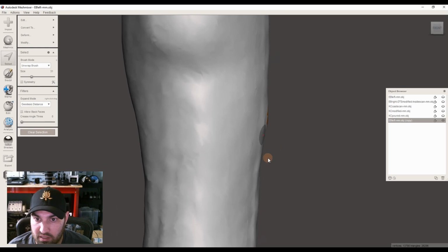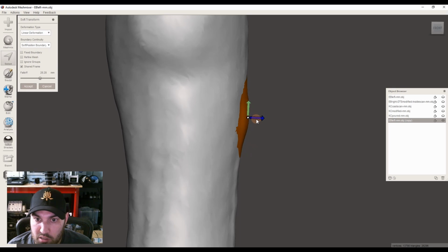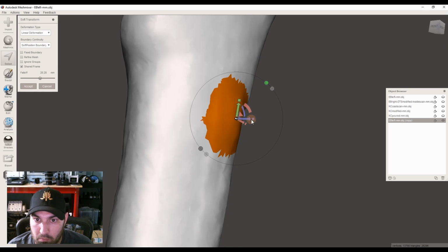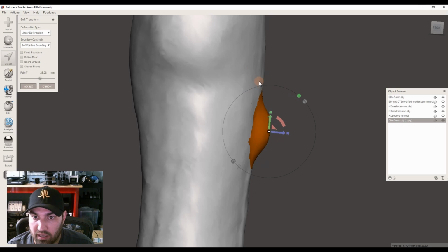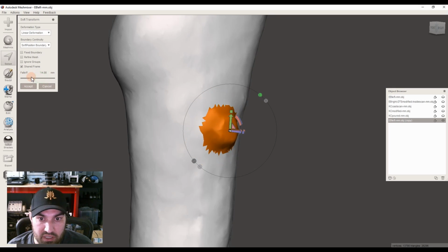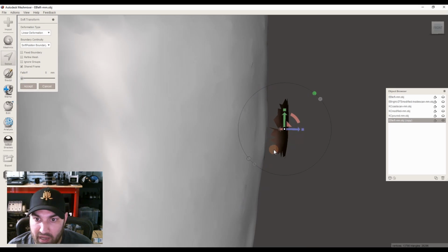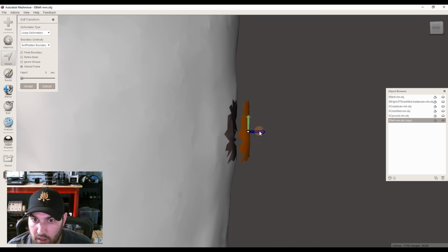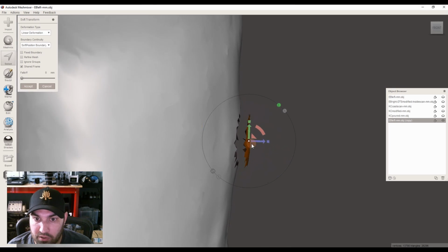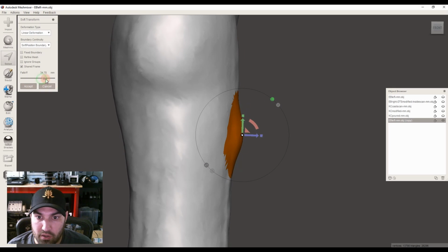So if we select just that apex and do it, we're going to get a smaller area being pulled and blended. And that region, that area, is your fall off here. So you can see how we can change that. So what you can actually do is take it all the way down and get a good look at how far out you're coming, and then slowly work it up to find the area that you actually want to blend out.